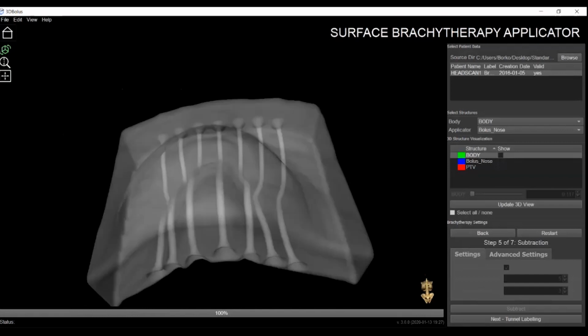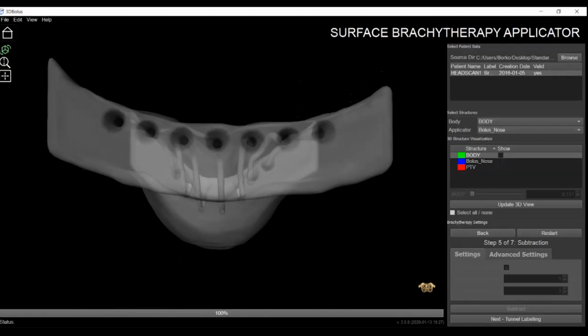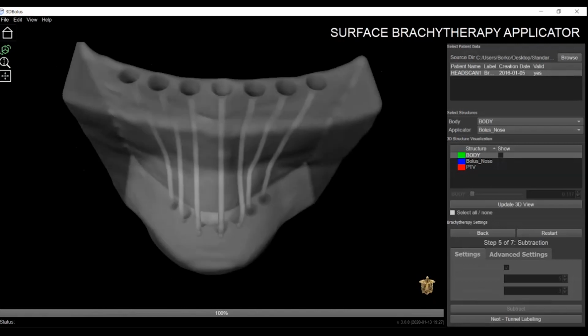As I said, this feature only has to do with the printing process, but it's highly beneficial, as you wouldn't want to print any device more than once, ideally, and not lose time with the printer. So again, this feature will help in that process.